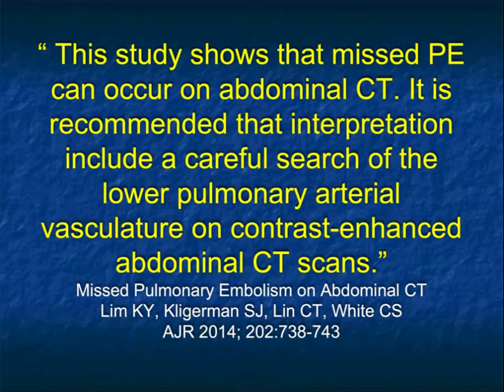What's interesting is that when we see them, they're most commonly in the right lower lung, not the left. Sometimes they're in both. I tell my fellows that if you don't have that much time, only look at the right lower lung because you'll pick up 95% of PEs. Don't look at the left. That's tongue-in-cheek, obviously. You've got to look at everything, but you can see my point.